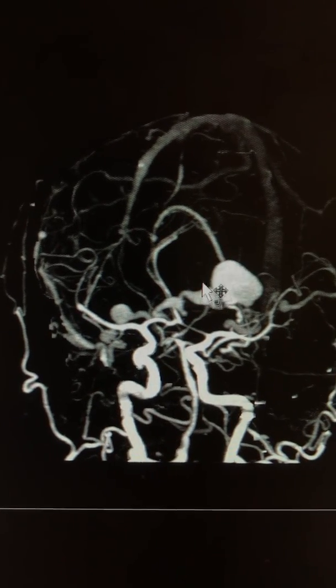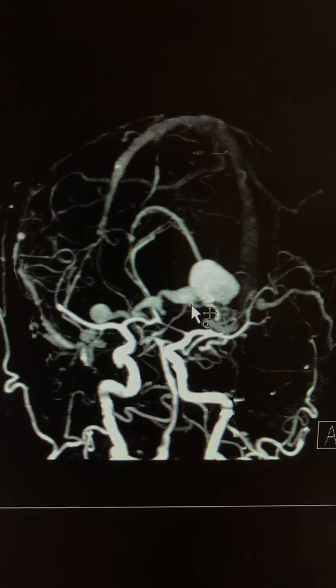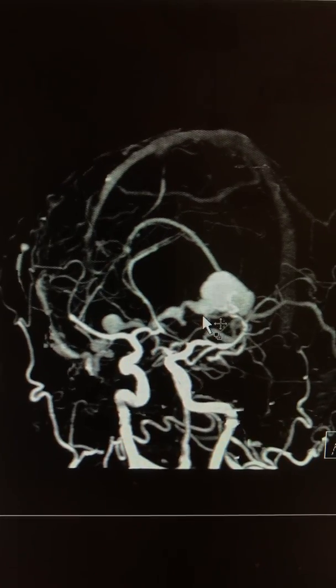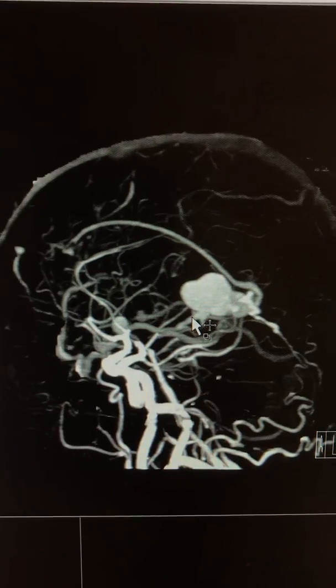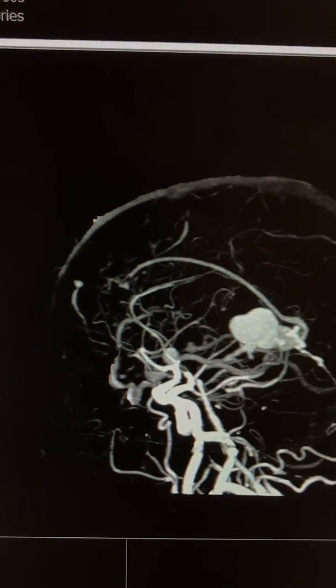Most likely the hemorrhage started from this dilated venous varix that bled into the ventricle. Due to the location of the hemorrhage, it is probable that it leaked from the ventricles into the subarachnoid space, rather than subarachnoid hemorrhage starting within the subarachnoid space.